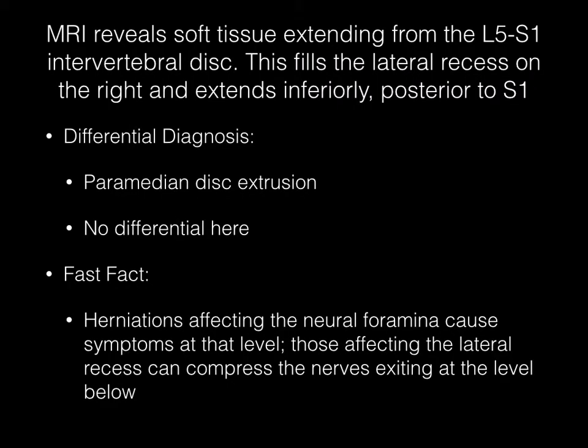Axial and sagittal T2 weighted MR images of the lumbar spine reveal soft tissue extending from the L5-S1 intervertebral disc. This fills the lateral recess on the right and extends inferiorly, posterior to S1. The diagnosis here is paramedian disc extrusion. There really is no differential.